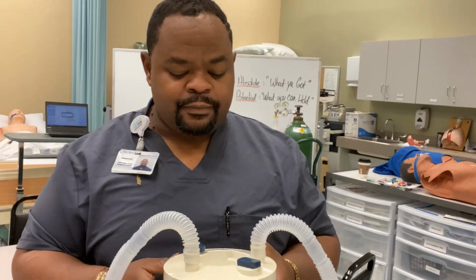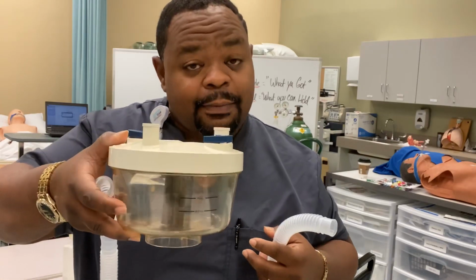Simple, right? Now, what happens is it's just like being on Riverside in Memphis, right? If I'm on the Mississippi River and I'm standing on the banks and a nice breeze comes across the water, well, not only do I feel the coolness, but I feel the moisture from the water because that's the gas that's passing over the water and coming to me, right? That's the concept of the Passover humidifier.